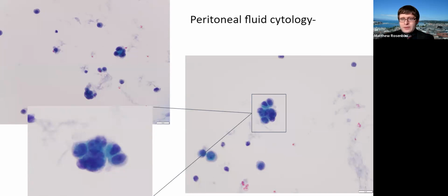So the cytology is relatively cellular. This is actually a thin prep preparation. That's sort of the bulk of what we do at BIDMC. Although, like we said, the cytologic features are going to be the same, regardless of whether you use a cytospin, SurePath, thin prep, or any other method.